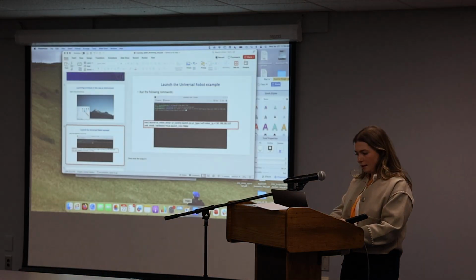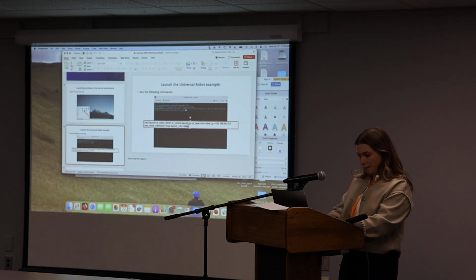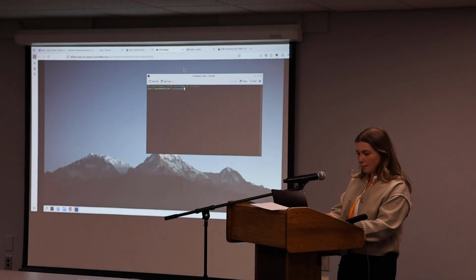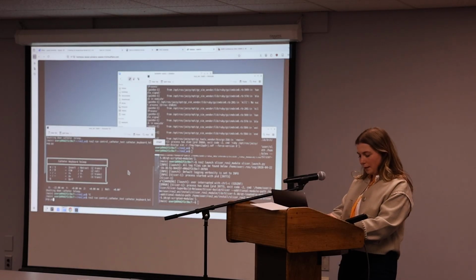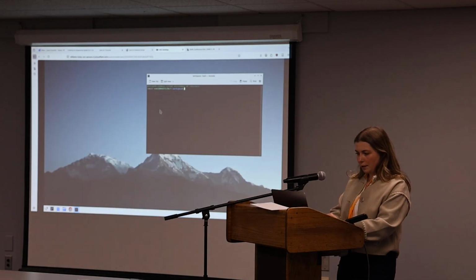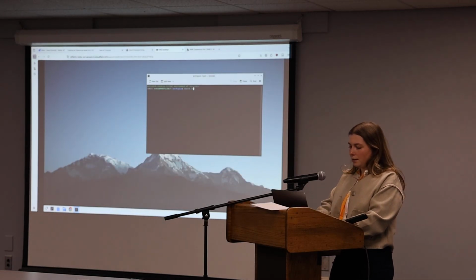Keep that open for a bit. You should have it on the tab too, or on the website if you're working there. And I'm going to launch it on mine as well. Okay, so we're going to source.